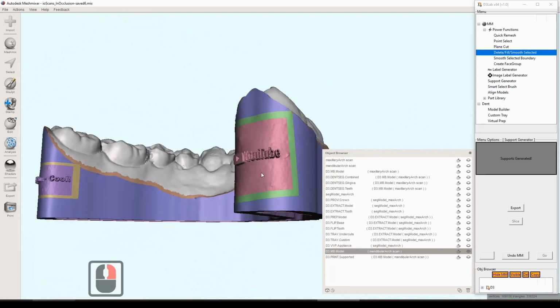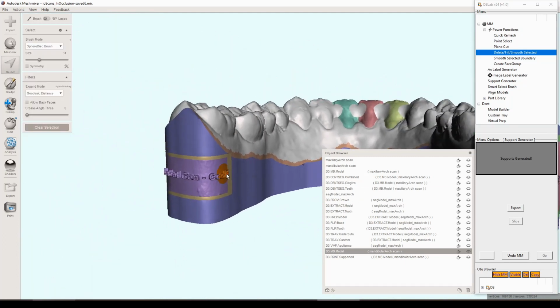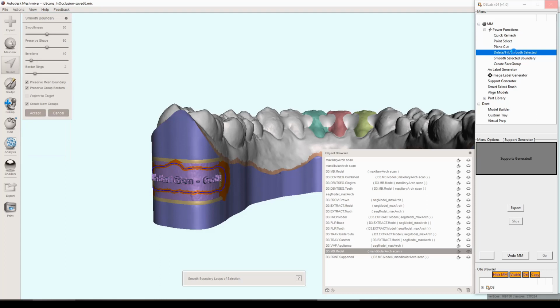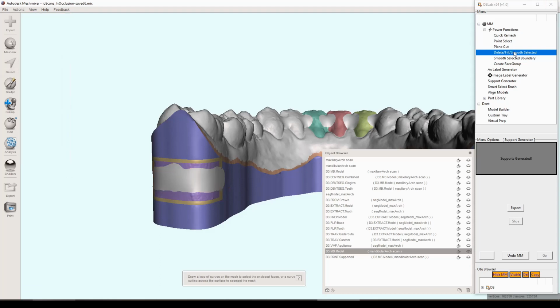The other thing that this can do is take off any existing labels that you might have. So if you happen to have any text or image labels on your model, then I can easily remove those as well. You just select the text or whatever was protruding from the model, and you can hit that delete, fill, and smooth, and it basically just magically erases it.